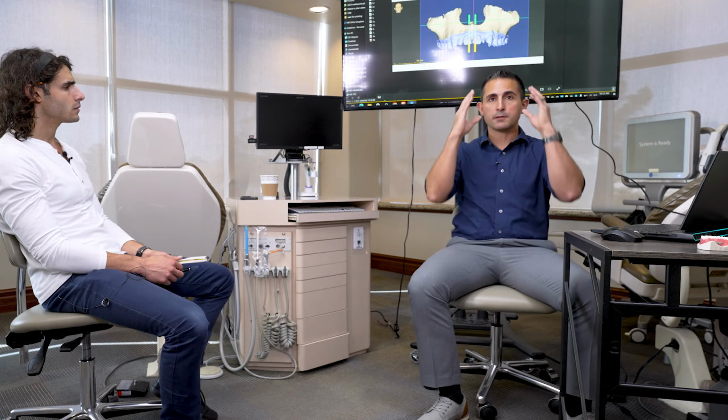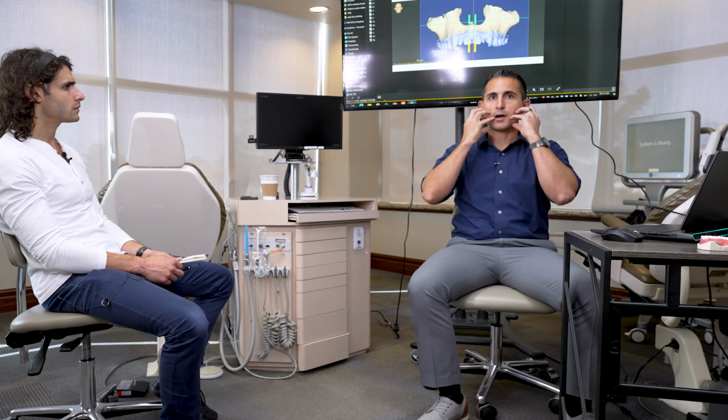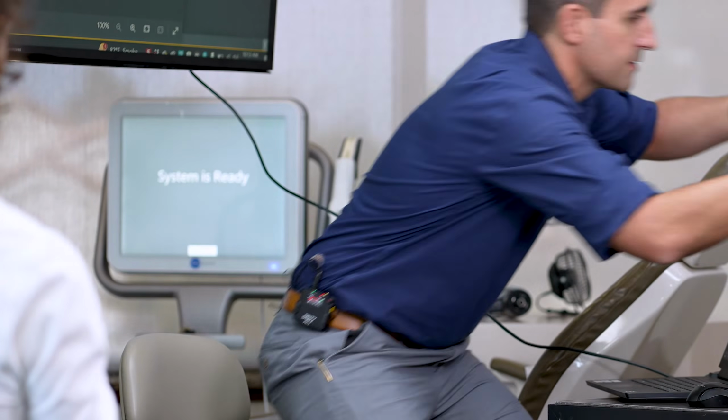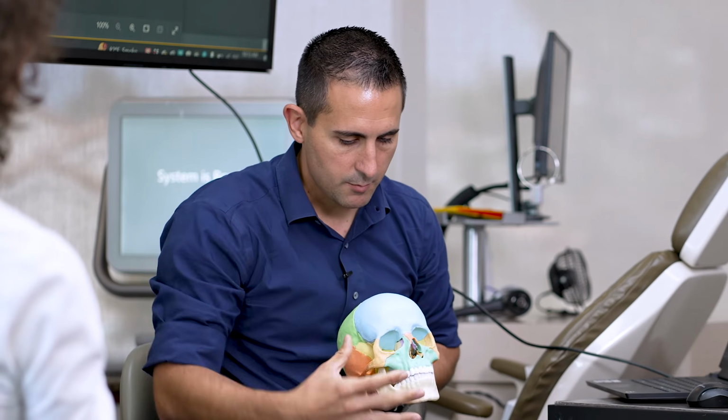Yeah, well, basically what they're telling us is, if your head is in the right spot, looking forward, straight, symmetrical, the way that most people look at you, what are those axes, right? Because the jaw and the teeth sometimes tell a different story. So you may be symmetrical here, but then down here you're not. So when you're expanding, if you're considering, well, maybe we can make that a little bit better. So let's say the top of your jaw is symmetrical, like from here up, it's good, but the bottom half is slanted to the side. It's completely off to the side.